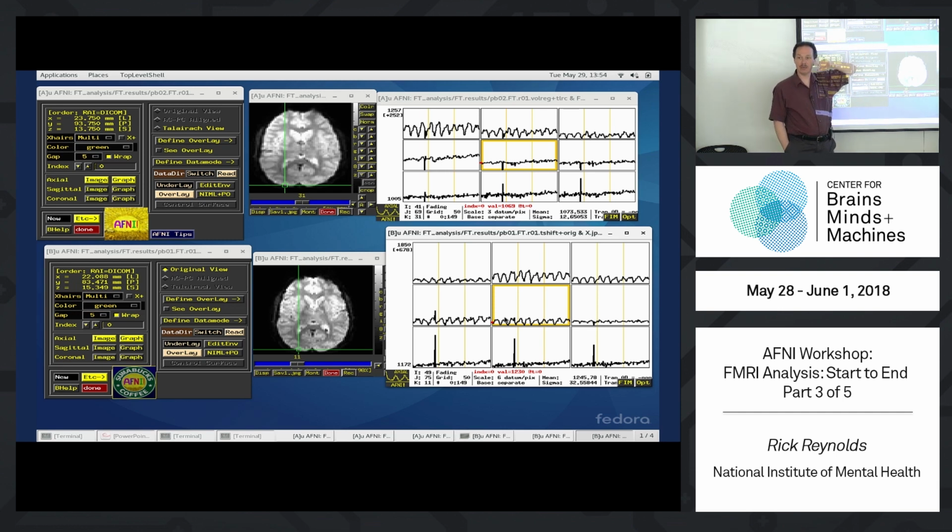What else? Anything? This is a little blurry. Yep, of course it's blurry because you've moved it around and resampled it. So wherever the voxels started out at, you're just rotating and shifting, but you're still resampling onto this fixed grid. So each point in the new data set is going to be created by interpolating the 8 neighbors somehow. We used cubic interpolation here. So it's going to look a little blurry because of that. And of course, you can choose the interpolation method.